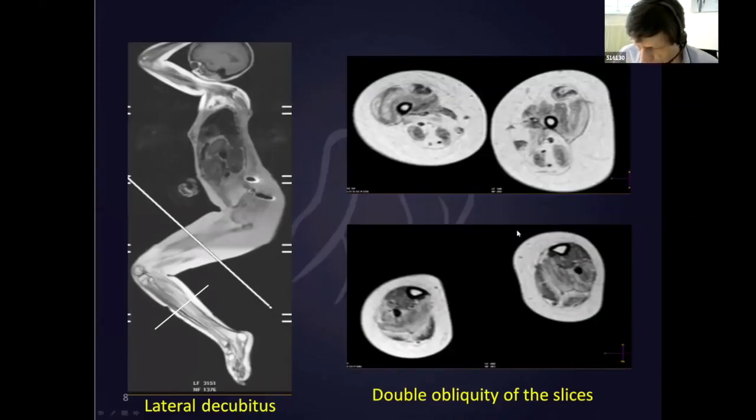In case of severe retraction, lateral positioning and reorientation of the slices permitted us to obtain a comprehensible anatomy. It is very difficult to interpret images with huge deformities, and you have to have a comprehensible anatomy. So you have to adapt to the clinical situation.